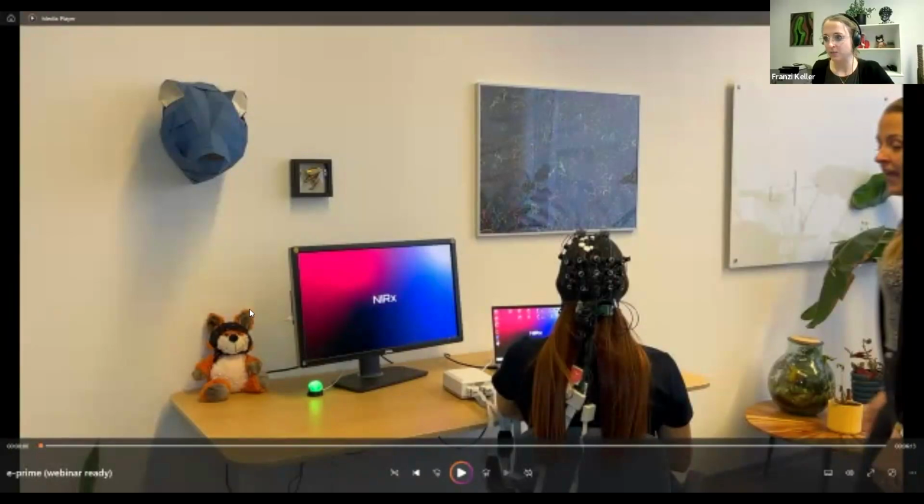And now I'm going to share my screen again, and I'm going to show you the pre-recorded demo. Because, yeah, you guys at PST, we didn't have a real device, so we wanted to show you guys what the use of the ePrime extension for NIRx looks like with a real device connected. So I'm going to go ahead and share my media player. Can you all see my video screen? Yes. Perfect. So then I'm just going to let the video run through. And again, if you have any questions afterwards, happy to take those. I hope you'll be able to hear the sound.